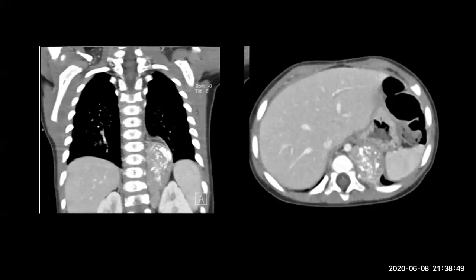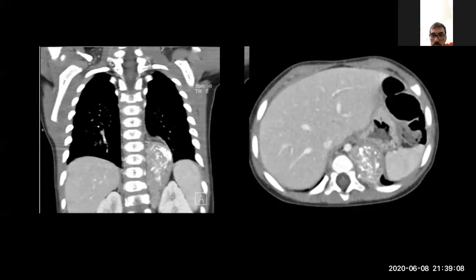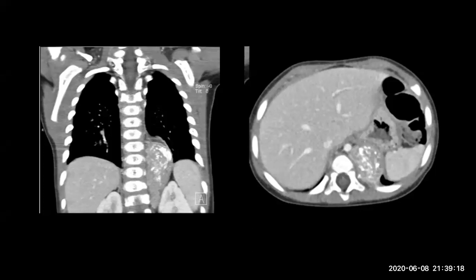This is a CT scan with IV contrast showing a well-defined mass in the lower thorax, maybe at the level of T7 or, as I see, T8, with a small calcification inside. The lesion is relatively well-defined, and it is in the medial aspect, left side. There is no evidence of intervertebral foramen invasion or intraspinal extension, as I see in the selected images.